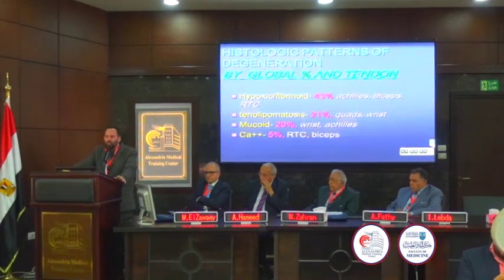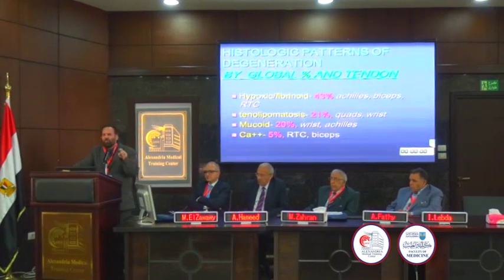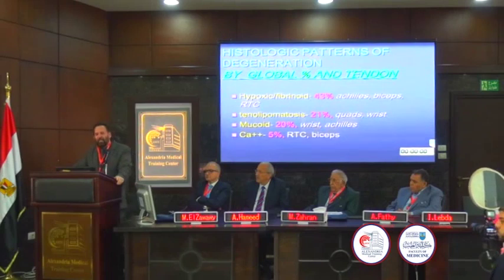Now, tendinolipomatosis, I hid the image, I'm sorry about it. It's seen in the quadriceps tendon. So when you see excessive signal in the quadriceps tendon, look to see if the patient had coronary artery disease. Probably did. And that's tendinolipomatosis. It's fatty, just like you get cholesterol deposits in your vessels, you get cholesterol deposits in your tendon. But it's not important. It doesn't lead to symptoms, doesn't lead to damage. Kind of an incidental finding.